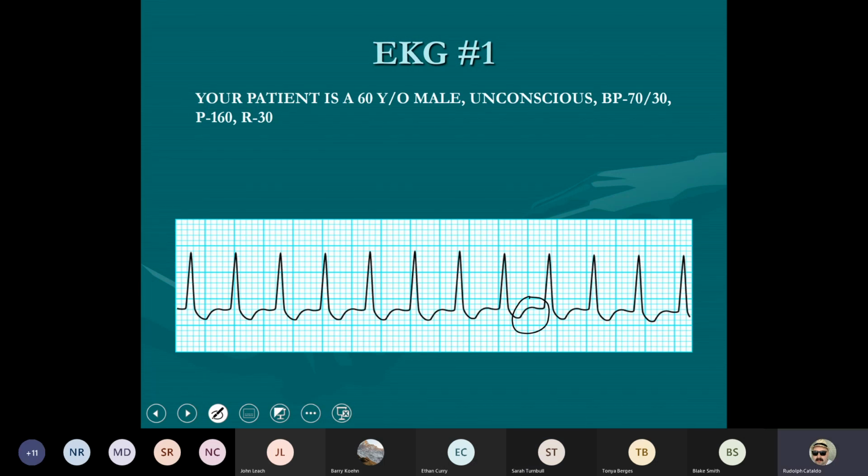I'm above 100, so I'm tachy, right? Do you agree with that? Correct. Yes. Above 100, I can consider tachy. It's regular. And I can't tell where the P wave is, between a T wave and a P wave. Automatically, I call it SVT. Okay. And it's over 150.